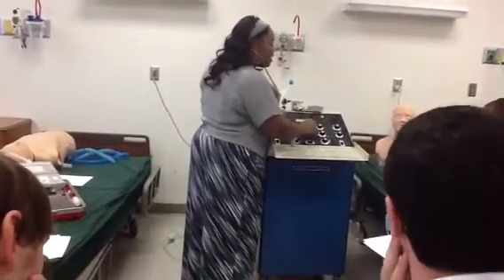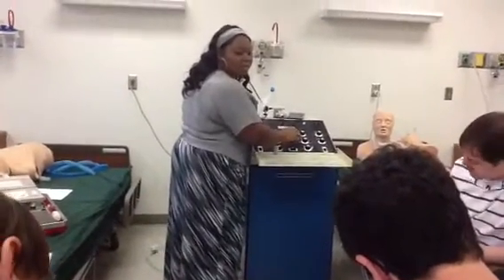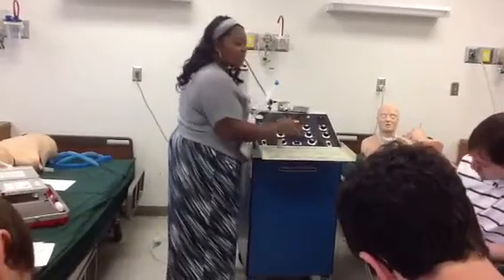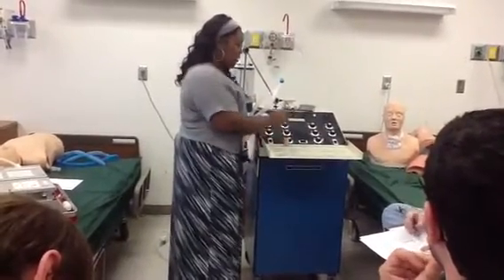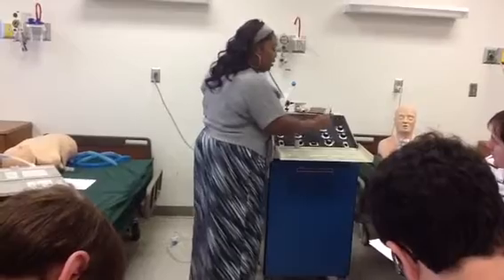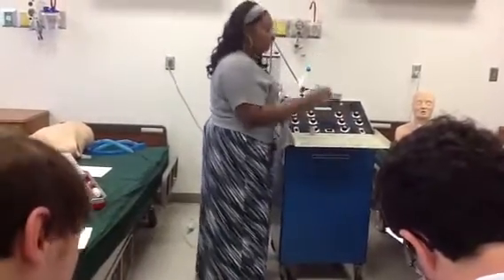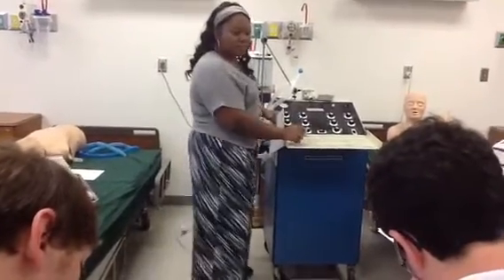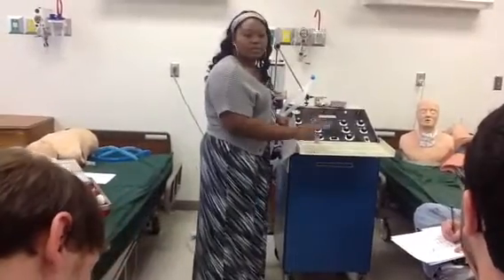Sigh volume, tidal volume. It's another setting. This is how much volume the patient is getting during a sigh breath. You set that using either 1.5 or 2 times the normal tidal volume that you set. So if you set the normal tidal volume at 500, your sigh tidal volume should be 1,000. You use 1,000. So you can multiply by 1.5 or 2. 2 is easier.